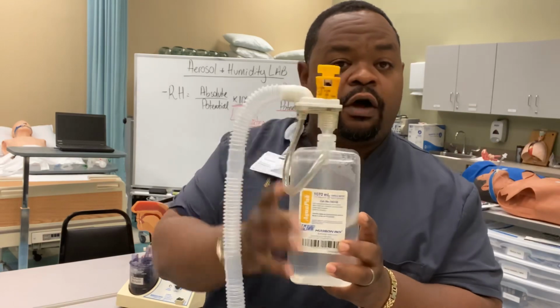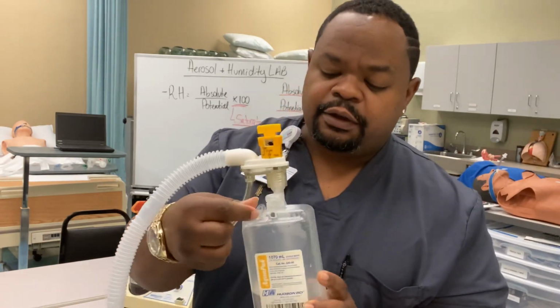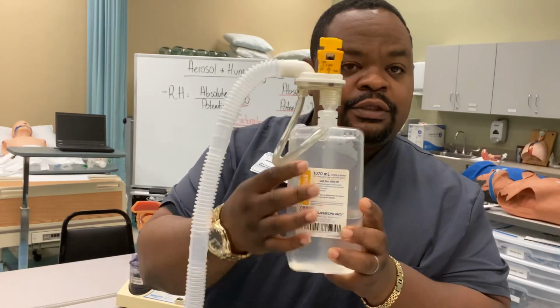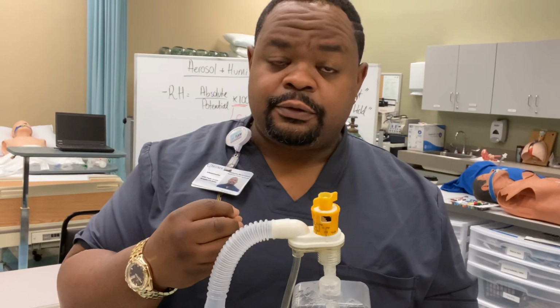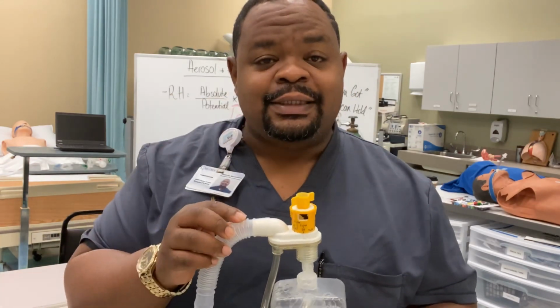This is a large volume nebulizer. Large volume nebulizer because it has a lot of solution or a lot of distilled water. It's a large volume nebulizer because a nebulizer will make large water particles smaller, okay? They use a baffle, which is a small device inside of your nebulizers that converts the water particles into a mist that you can see. That's what the baffle is for, okay? This is a large volume nebulizer, and the breathing treatment is a small volume nebulizer, right?